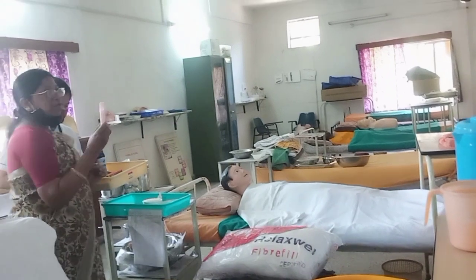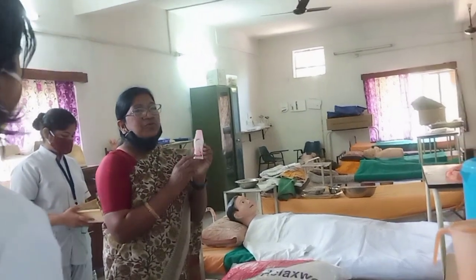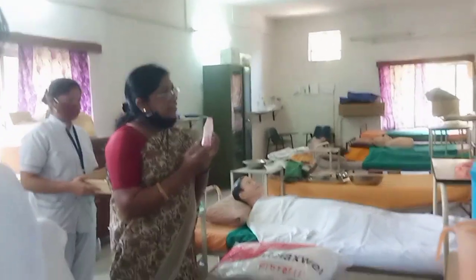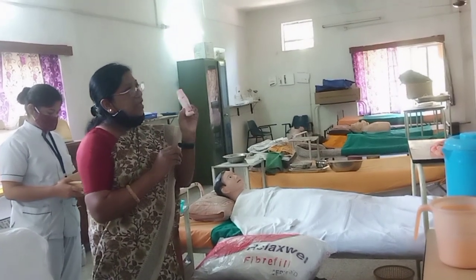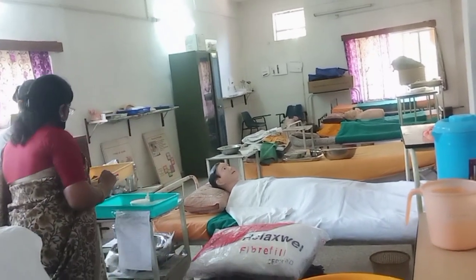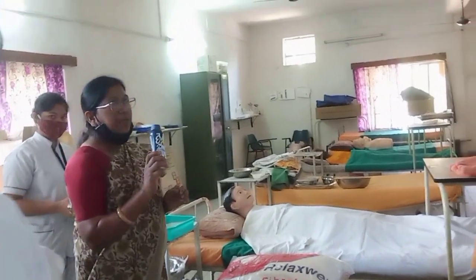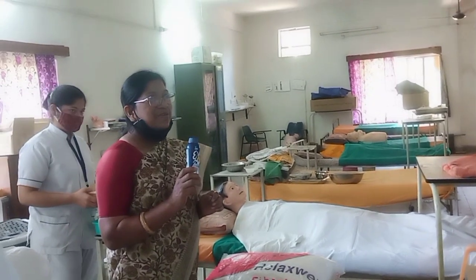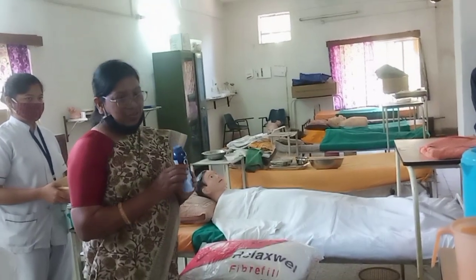This is lotion, body lotion. Okay, so this is for the smooth skin. Okay, so because while the patient is on the bed, that time आप जब बेड बाथ देते हैं पेशेंट को सूखा स्किन नहीं रहना चाहिए, so we can keep patient fresh, we have to use the body lotion also. This is also talcum powder. This is a special powder actually to protect from the itching. Okay, in the summer season. Okay, so this is very important.